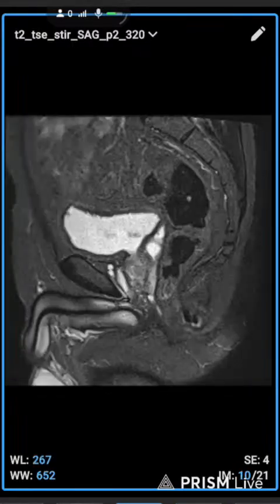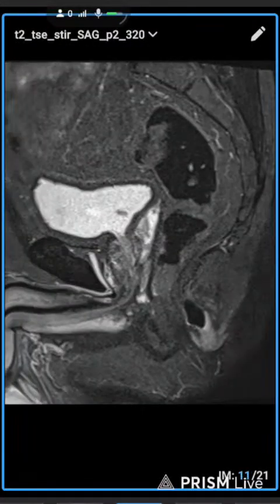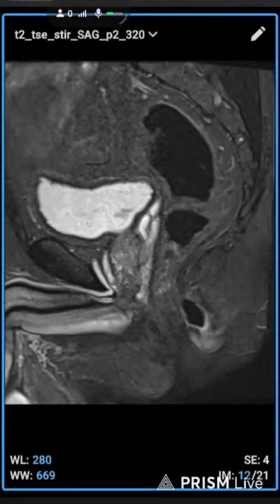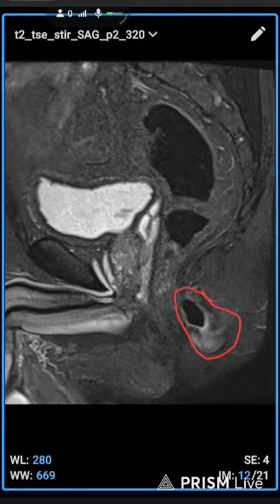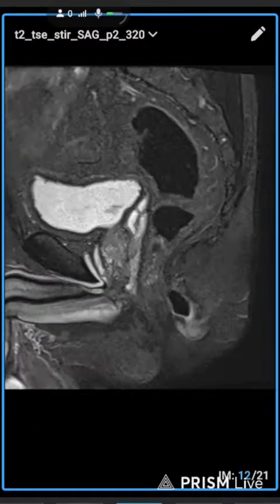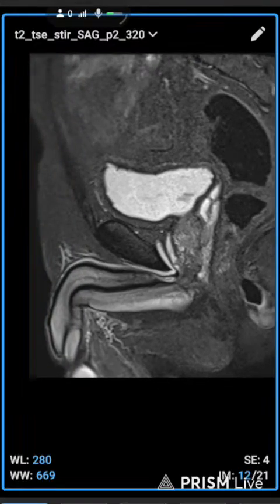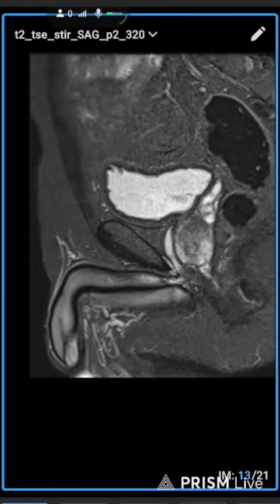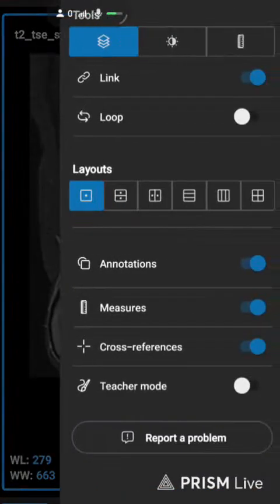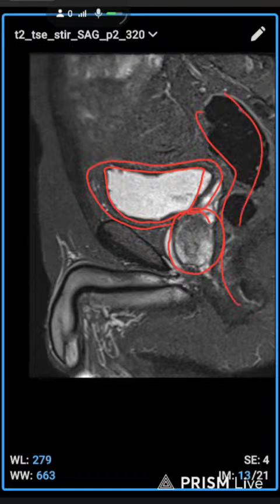So in this patient, the abscess was fully visualized properly, just because it's too big. Here I am showing you the prostate gland, and this is the bladder. This is the sigmoid and this is the anus.